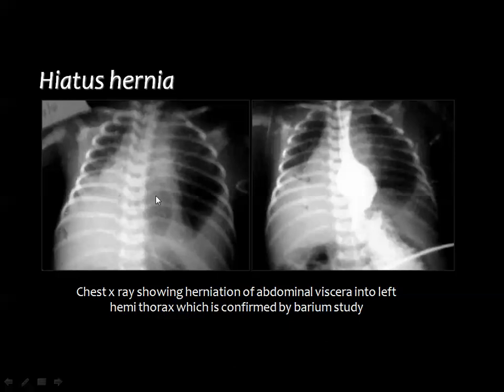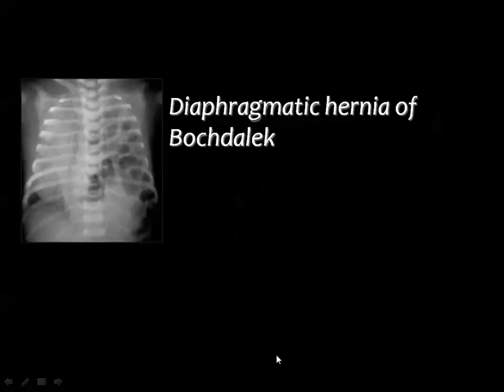And you see in the chest X-ray there are some pleural effusions, and you see this gas shadow, which is confirmed to be part of the stomach by barium study, herniating into the lower part of the chest. And diaphragmatic hernia is the most common gas containing shadow in the chest compared to other pathology.